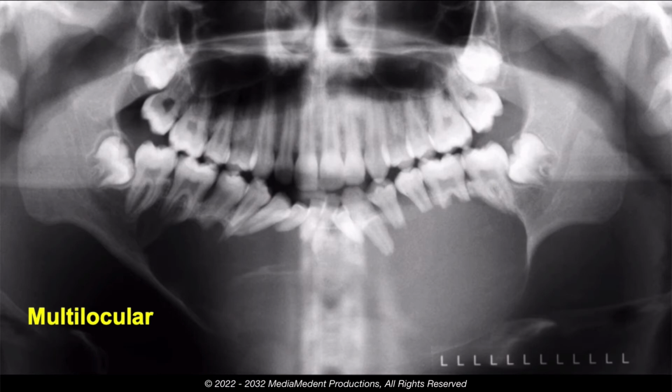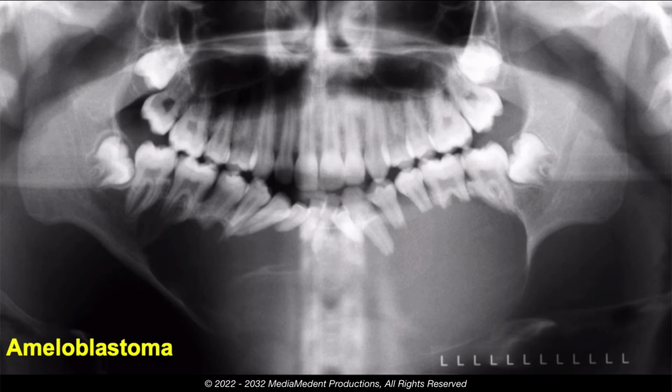The inferior border of the mandible was expanded and thinned. The lesion appeared to have displaced some teeth and caused root resorption. The usual radiographic appearance of the lamina dura and periodontal ligament space of some teeth in the area appeared to be lost. All regional teeth tested vital.